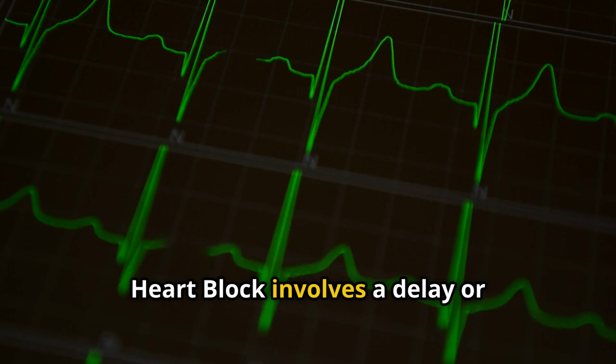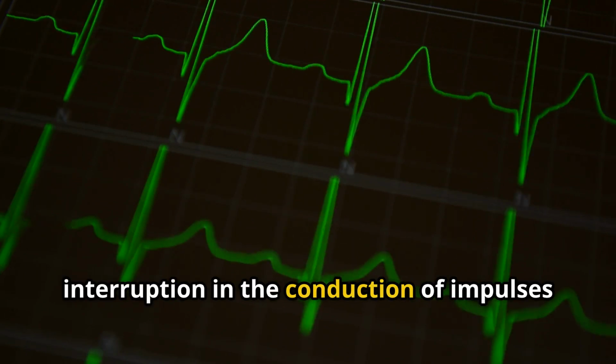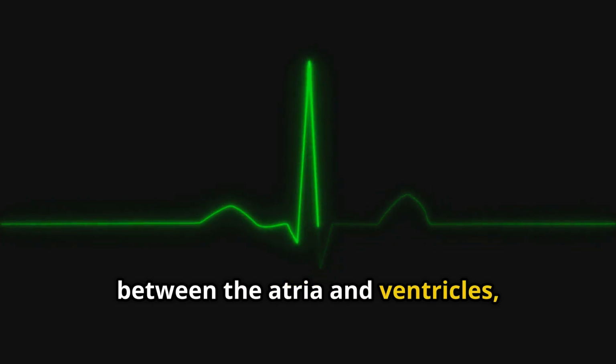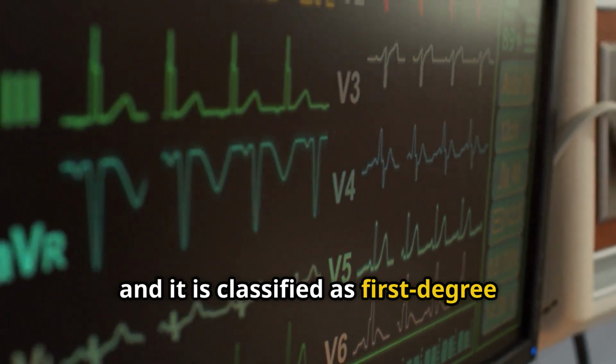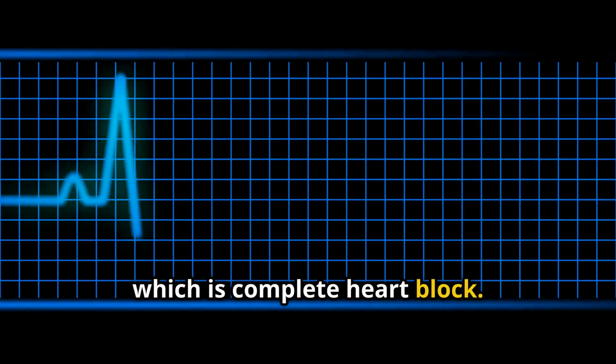Heart block involves a delay or interruption in the conduction of impulses between the atria and ventricles, and it is classified as first degree, second degree, or third degree, which is complete heart block.